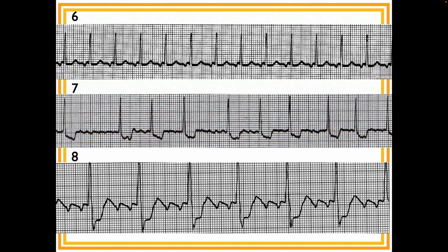So I'm going to call this irregularly irregular, partly because I know it, but partly because one of the problems with the 6-second strips, and this is not a terribly fast rhythm, is you don't have a ton to go on. And again, we love to see patterns. We're always trying to find patterns in things that aren't there.